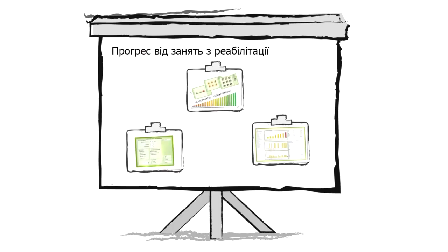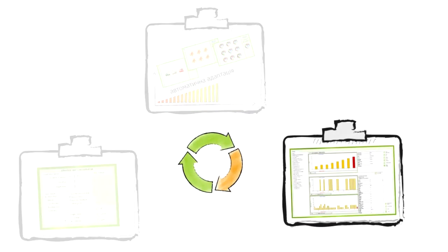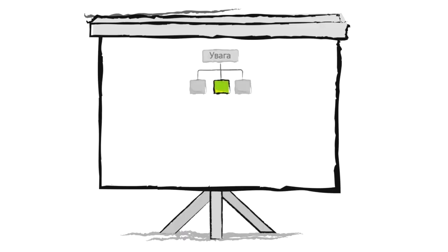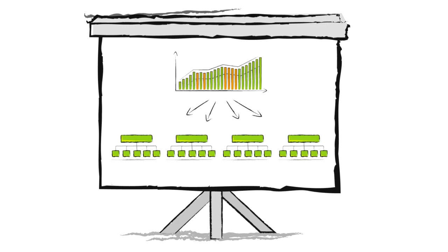In summary, the progress of work for one RехaKom module is now shown. The patient starts working with RехaKom at an easy level. The auto-adaptive mode keeps the difficulty of training at a level appropriate to the abilities of the patient. After therapy, the therapist analyzes the training results. When any adaptation is needed, it can be made in the parameters menu before the next therapy session starts. Your knowledge about the therapy module, attention and concentration, can now be transferred to all other RехaKom therapy modules because they follow the same principles and structure.